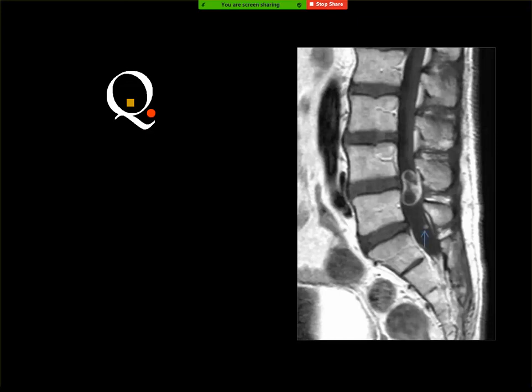Sagittal MRI of lumbosacral region. Yeah. This is neurofibroma, I think, sagittal MRI, T1 post contrast. Yes. And this MRI is showing mild enhancement with cystic degeneration, neurofibroma. Okay. It is a subdural lesion. Yes. This is an intradural or subdural pathology, and this mass is partly cystic and partly solid.